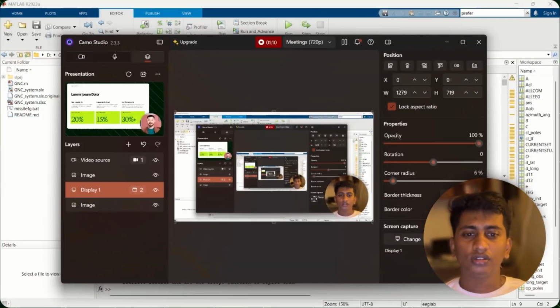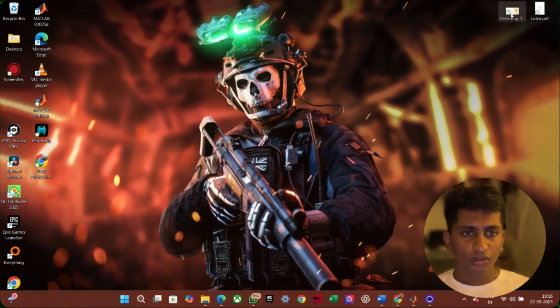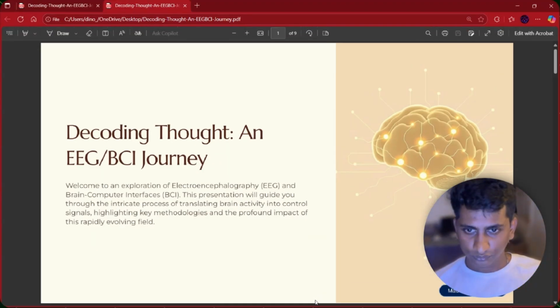Perspective. So check whether it's working or not. So I hope you can see the screen. And yeah, this is MATLAB. So let's open this. Okay.